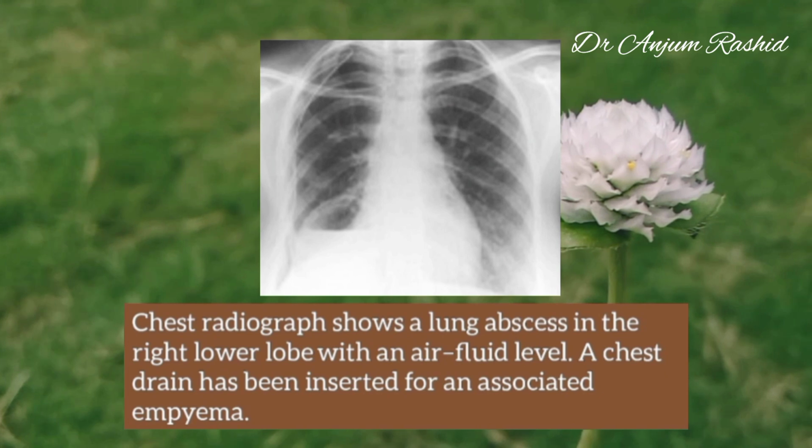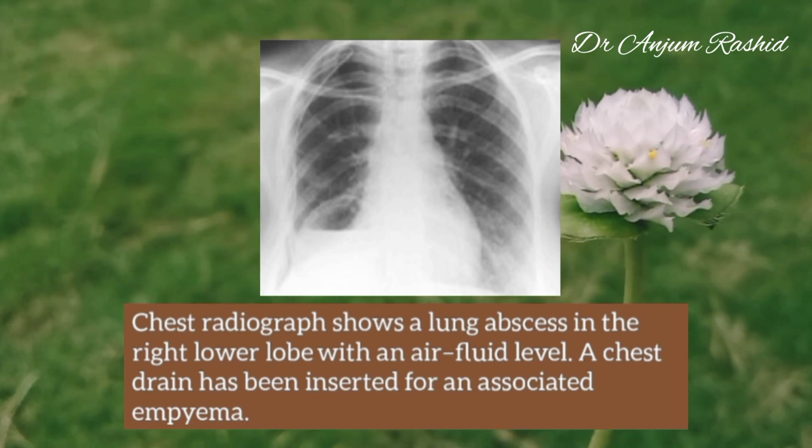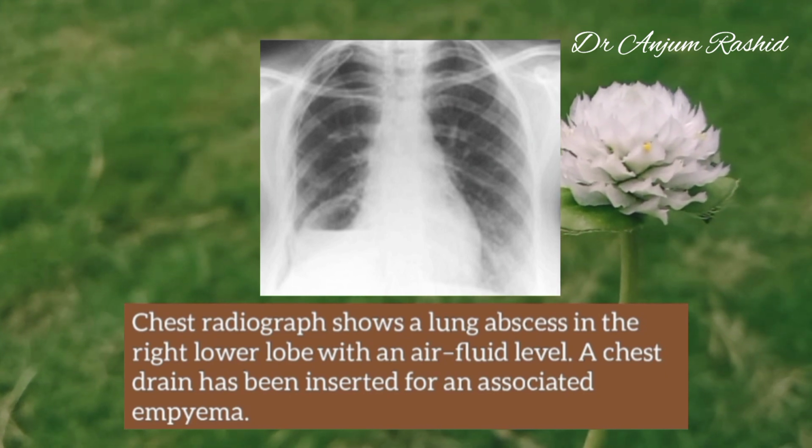Now, this is a chest X-ray showing a lung abscess in the right lower lobe along with an air fluid level. A chest drain has been inserted for the associated empyema.